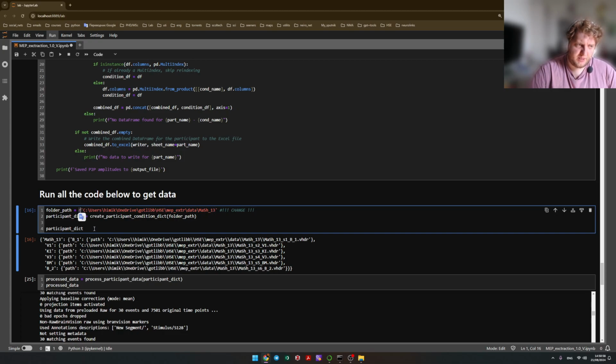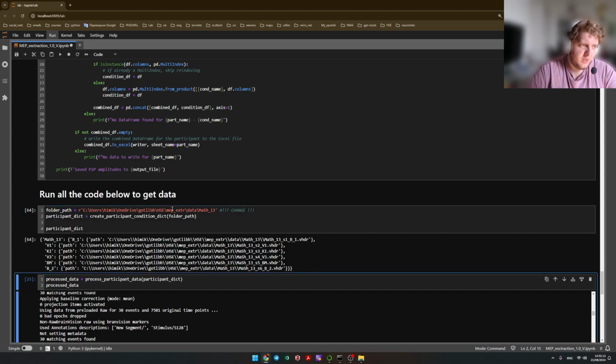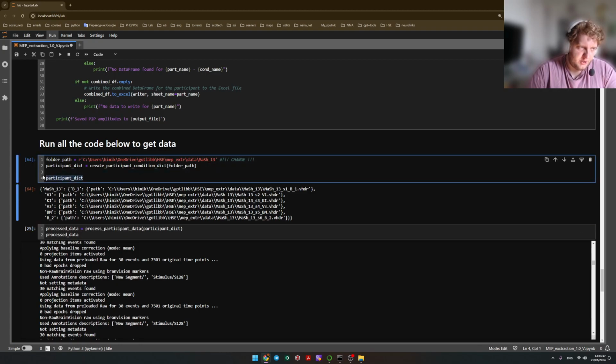Don't touch this symbol, because it's important for understanding that this is just a string and other stuff. This is a thing in Python, you don't need to understand. And this is our dictionary. In this case, this is our database structure for this analysis.